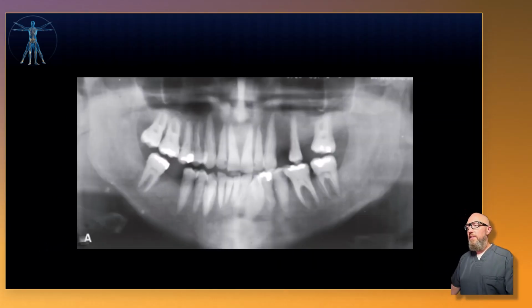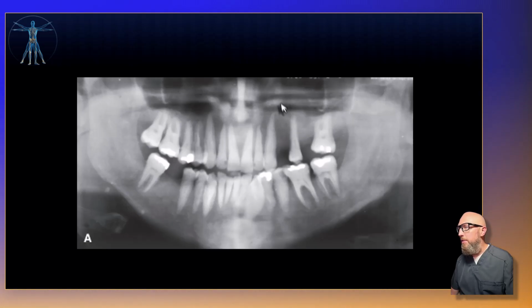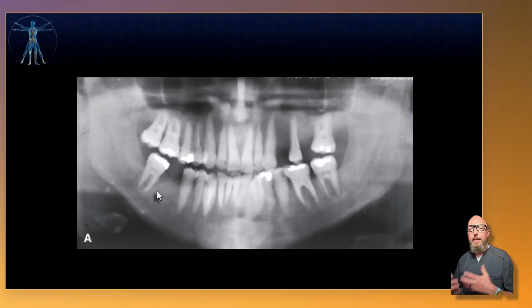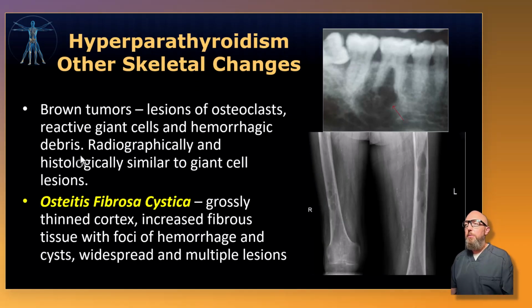All right, so if you see this image again, is it going to stand out? Are you going to be looking around and saying, okay, where are the sinus borders that Dr. Meekum always told me to look for? They're not here, but they're missing on both sides, and there's this overall change to the bone structure. As long as you look at this and think there's something systemic, maybe if you appreciate the ground glass appearance, you might go to hyperparathyroidism. But as long as you're leaning towards systemic and more information needed, that's where you need to be as a dentist treating these patients.